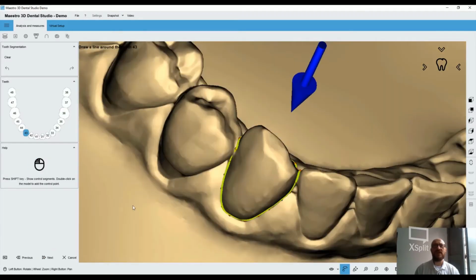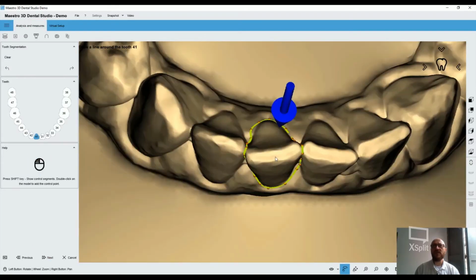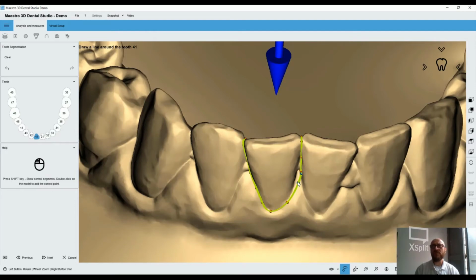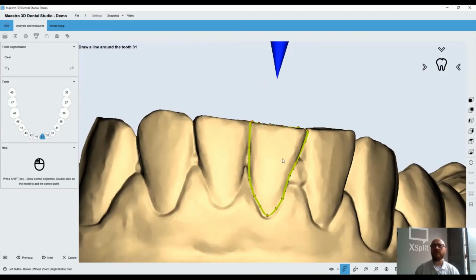I have to check element by element. It's okay, I'm doing very fast as I told you before, so please take your time when you wanted to work on this project.